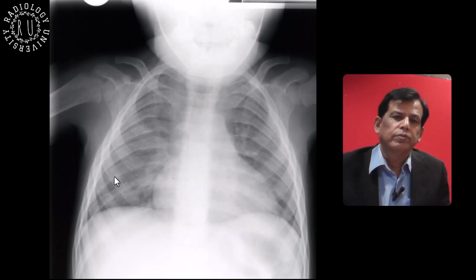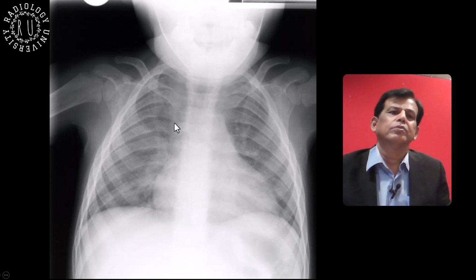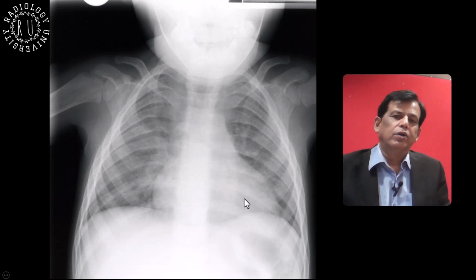The same patient: a frontal radiograph of the chest of a skeletally immature patient. I'm taking some time to review the films. I can see a subtle haziness to both lung fields, however the cardiomediastinal contour appears normal to me. The bony thorax appears unremarkable. Soft tissues appear unremarkable. Some haziness along the paratracheal region bilaterally. What do you think about the bony thorax here? I cannot see any definite sclerotic or lytic lesion.